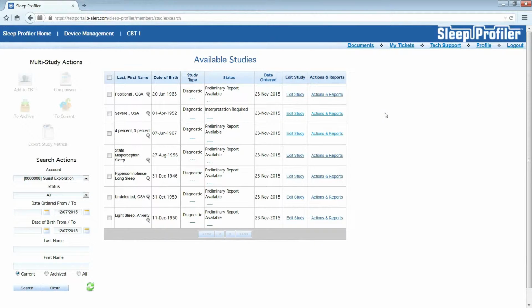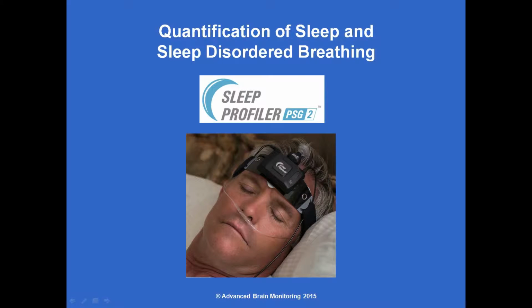Feel free to use guest exploration in combination with this video to evaluate the accuracy and efficiency of the quantification of sleep and sleep disordered breathing with Sleep Profiler PSG2.